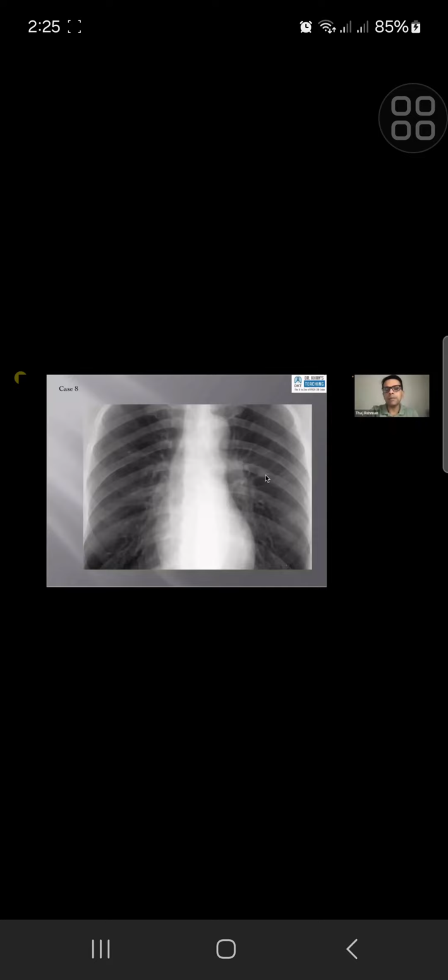Well picked up. Good job. That's what you're referring to, isn't it? Yes, excellent. The rest of the X-ray is fine. There are no previous radiographs.